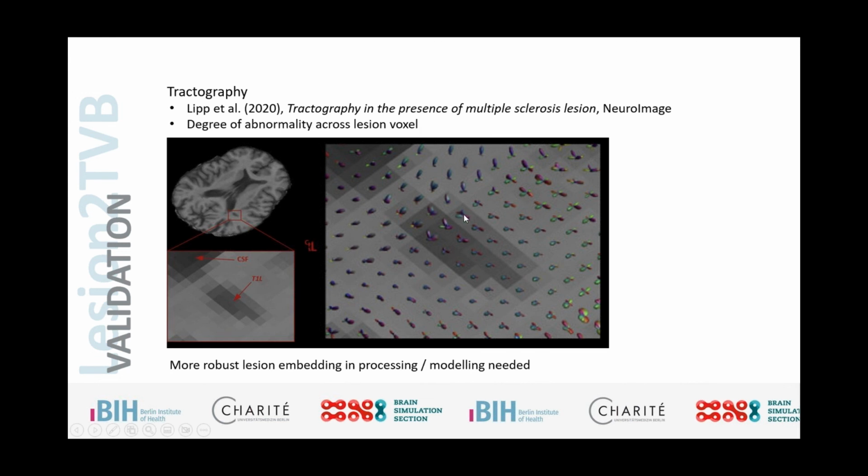They looked at the actual probabilistic directions inside of those voxels and found that inside of the lesion, in the darkest spot here, we see probabilistic patterns that are very similar to what we see in CSF outside, which represents a feasible and viable barrier for anatomically constrained tractography. In the only slightly grayer regions, which are still part of the lesion itself, we see patterns that still somewhat represent what we see in the white matter. So setting all of this to 0 might be overkill, and we might lose information about the actual lesion, especially considering what we saw at the beginning: longitudinally, we have this dynamic of the lesion, and most likely all these gray areas are in the subacute and chronic state no longer represented this way, and are no longer part of the actual lesion itself.